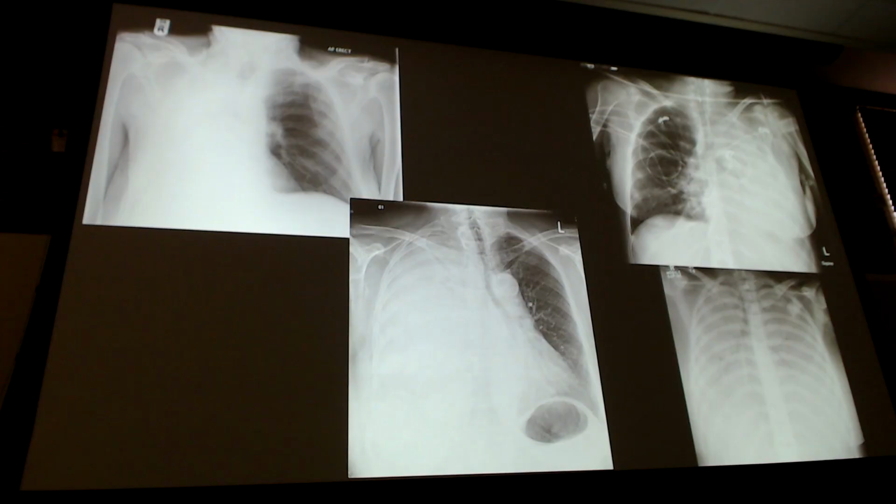Now, if I give you most likely choices on just an image for these three, right? And the choices are atelectasis, pneumonia, massive pleural effusion, and I make up two things that aren't opacified hemithoraxes because those are the only three ones we really talked about, right?